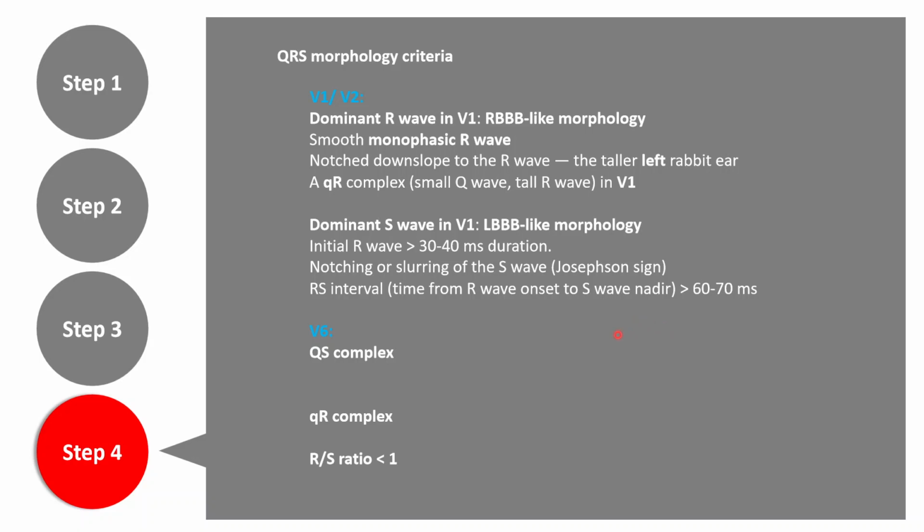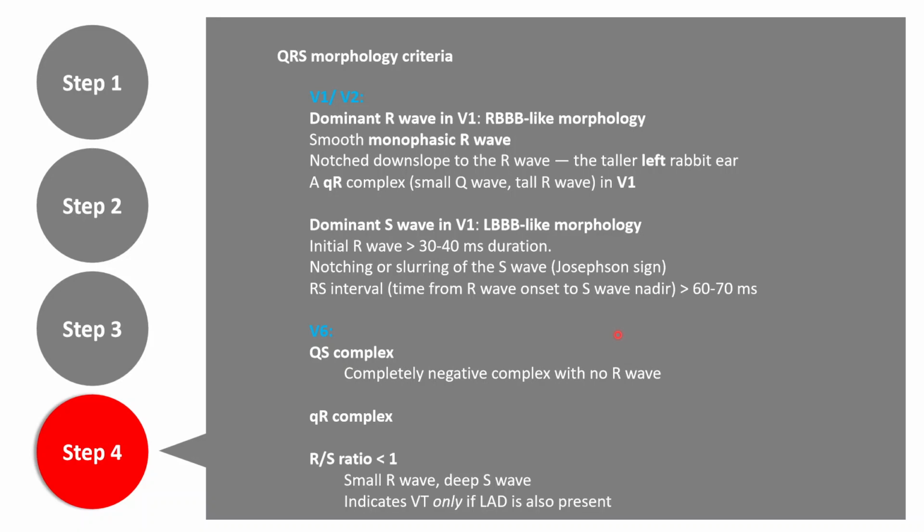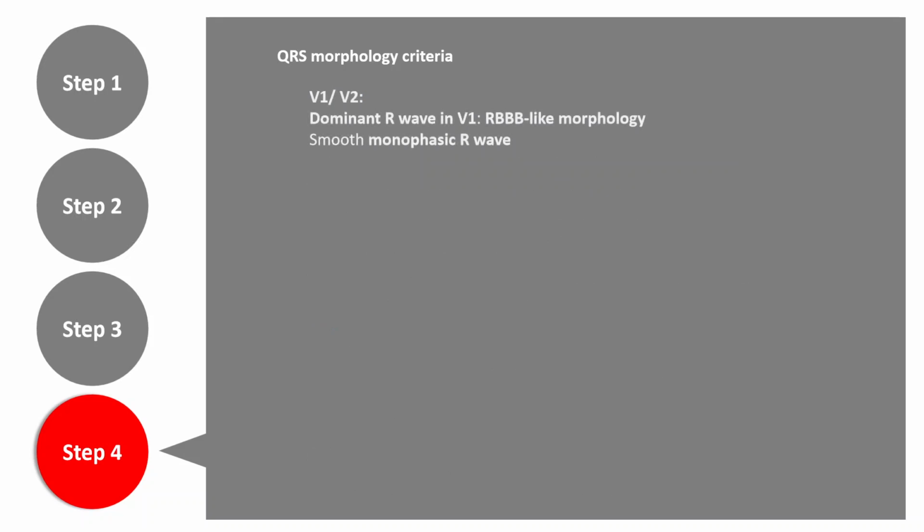In case of the V6, we talked about that, and we talked about the RS ratio as well. Okay, let's get into a little bit more details with a couple of examples.